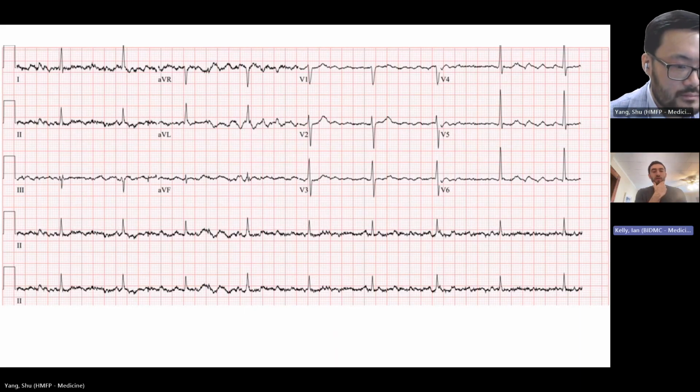We're going to put you in a very familiar practice situation for this EKG here. Let's say you're on night float and you get a message from one of the nurses saying, hey, this patient is alarming on tele for new atrial fibrillation, atrial flutter. You look at their history and they've never had it before. Like the excellent intern or resident that you are, you go see the patient at bedside, they're doing totally fine, and you decide to get a 12-lead EKG. And this is what you see. Go ahead and pause yourself here. Go ahead and think about this, and then we'll go through the answer and break this down together.